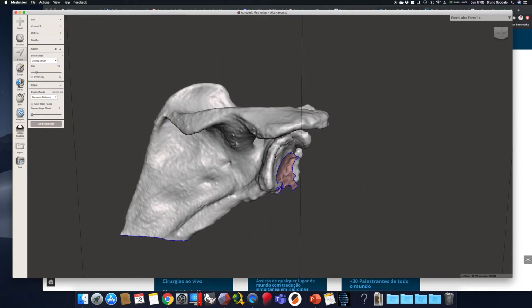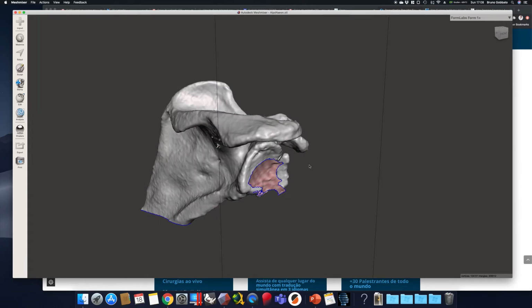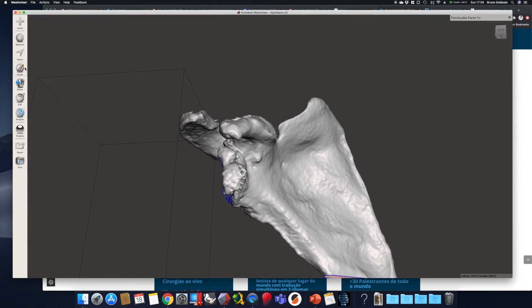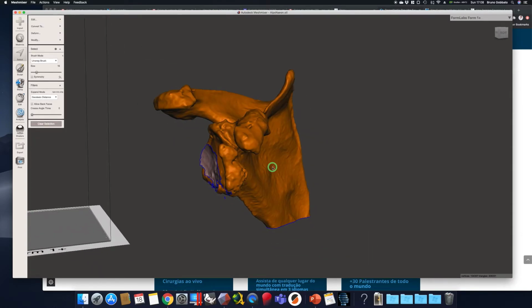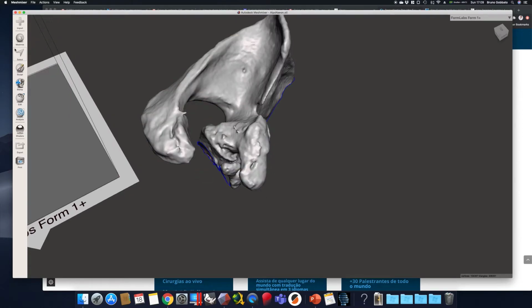I'm going to select again the glenoid. Let's see. Okay, everything is selected, so something is touching. So I think here. So we need to delete this small part here. I'm going to just draw around. Hit delete. Again, hit again 2 times on the scapula. Now we see that the part of the humerus is not being selected.